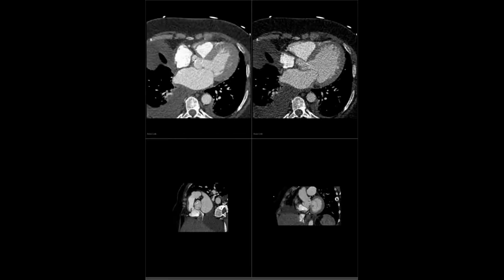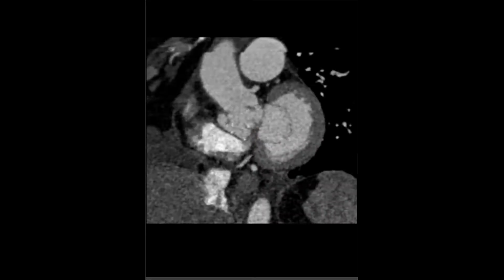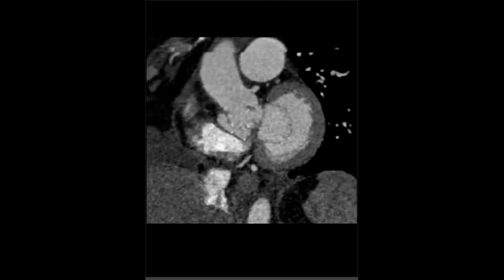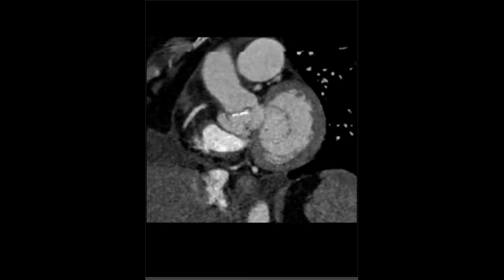And then a lot of times they'll go to this, which just frankly pops open. But yeah, that was either several weeks or maybe a couple months ago where she had that inpatient endocarditis treatment. And then she was referred to this as an outpatient, not so much for aortic stenosis as aortic regurgitation. And in talking to the interventional cardiologist, he thought maybe this was the source of the acute regurgitation since it's fistulizing both above and below the valve plane.